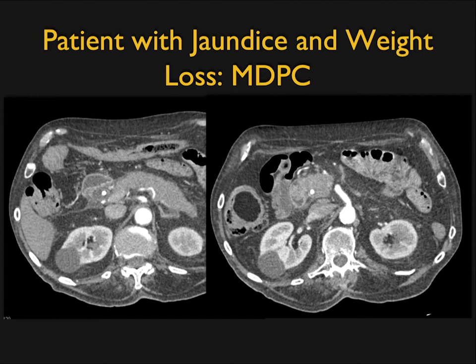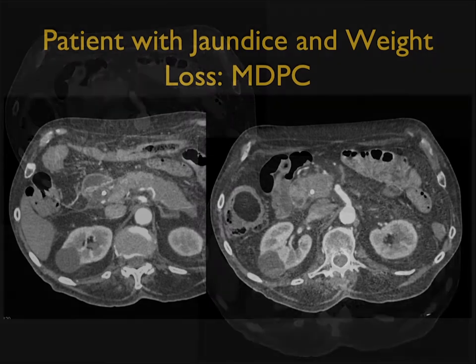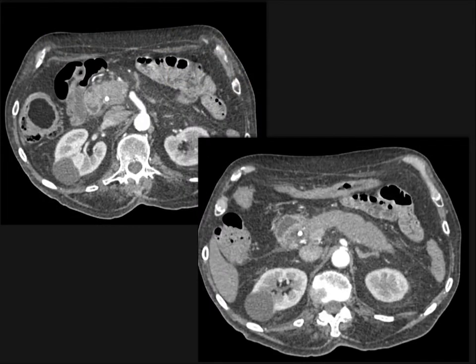The patient presented with jaundice, obviously pancreatic cancer. But, you know, it looked kind of, particularly the body and tail, when do you see such a big mass infiltrating the entire gland but no dilated pancreatic duct? Oh yes, there's an incidental lipoma in the colon. But we look at it, okay, maybe it's a cancer, but just get an IgG4. They got an IgG4. And remember again, it's always the same story.